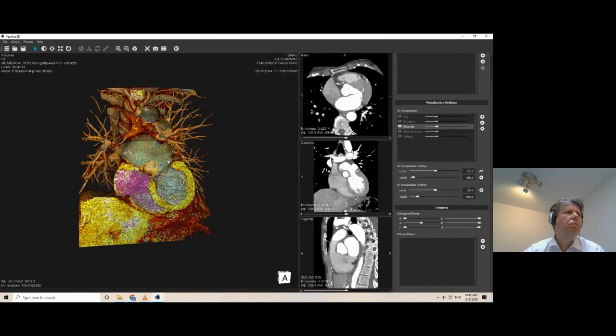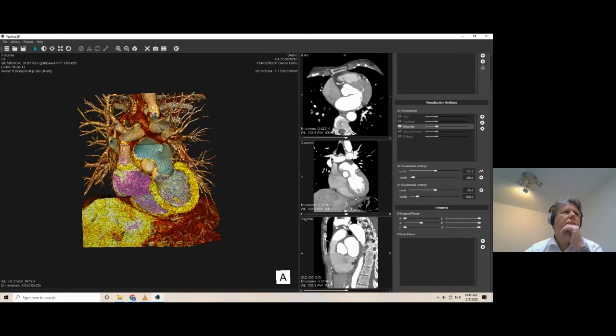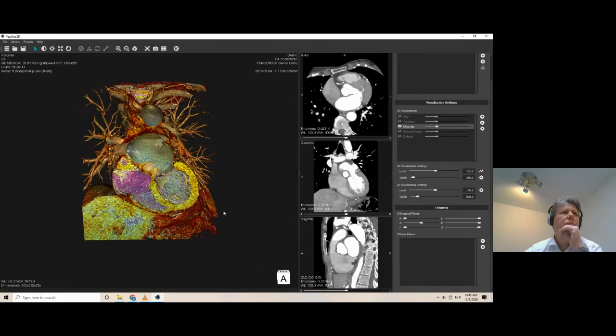You show them to the camera and make sure that they're inside of the camera. And by using one ball, you can manipulate the data set. You can do it with your left-hand side, for example. And then you have the other hand available to do all types of interactions. So slice through it, make it bigger, make selections, etcetera. And that's a very intuitive way of working with these data.